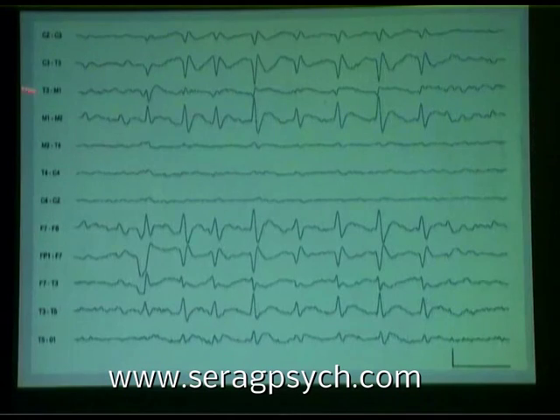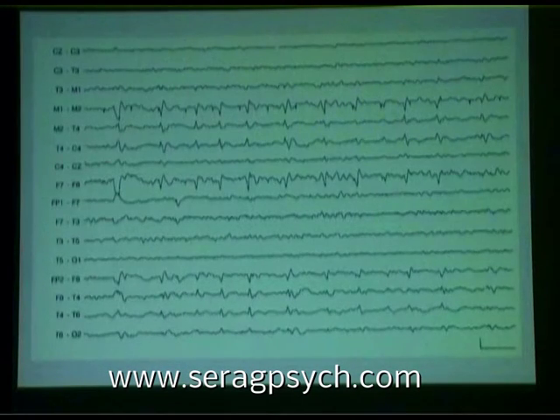And the mandibular notch electrode is heavily involved. You can see that because it cancels with T3, T3 definitely involved. And notice M2 you can see is not involved at all. So M1 going up to M2, and you can see the very considerable involvement of the mandibular notch electrode. Next, please.